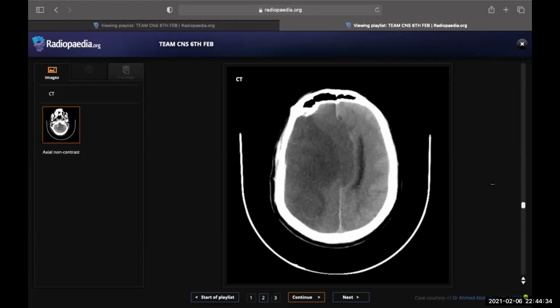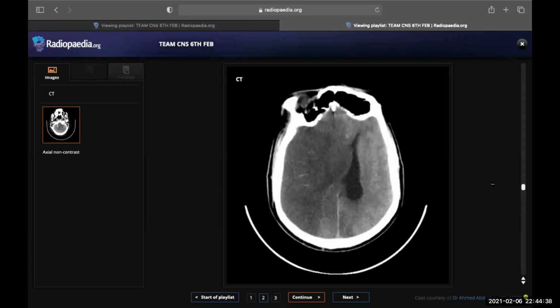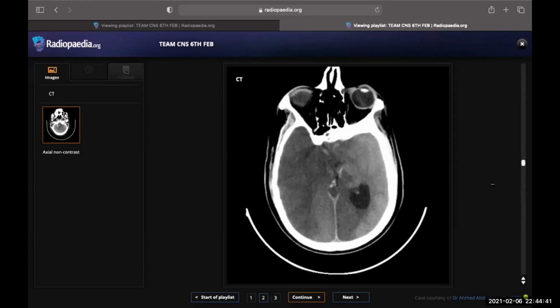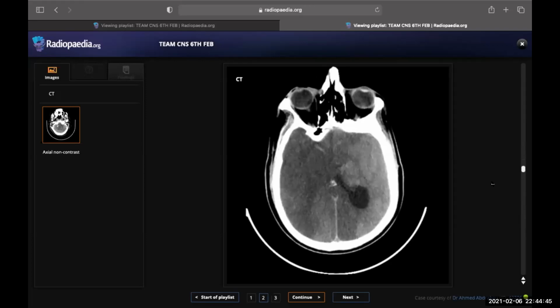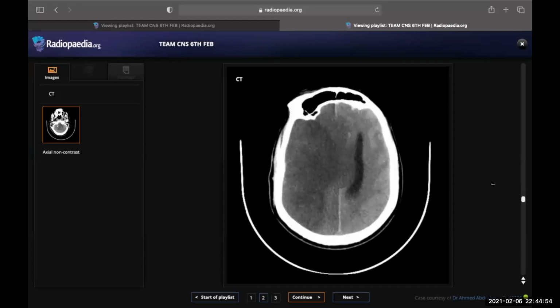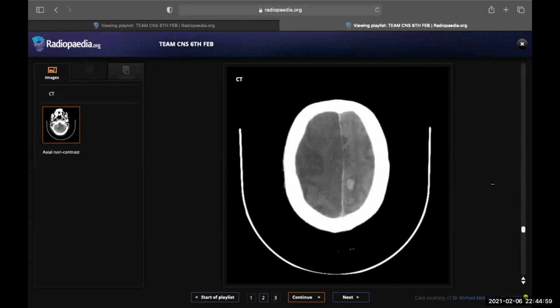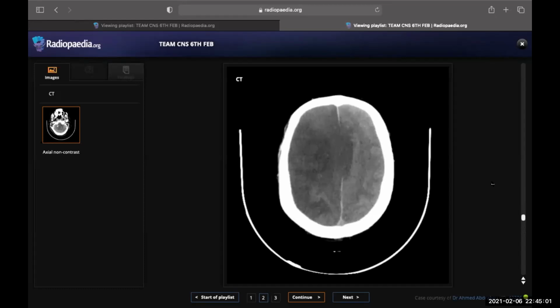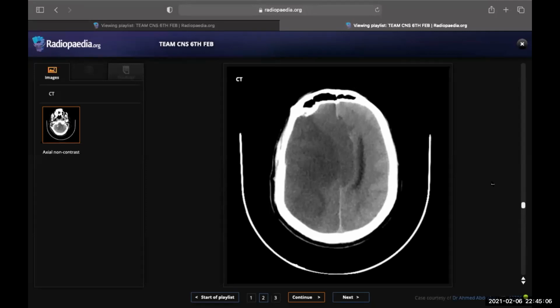The first thing you'll think when we are doing our routine work every day, if we see such a large hypodensity involving the right cerebral hemisphere. Yeah, so I think this hypodensity is mainly because there is herniation. Good. Why is there herniation? Because of the mass lesion in the brain stem. Okay. Mass lesion is a good differential. Let me cut it down. This is not a mass lesion. This is an infarction, an acute infarction.